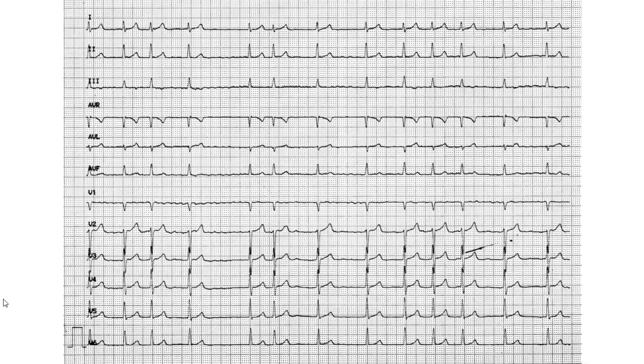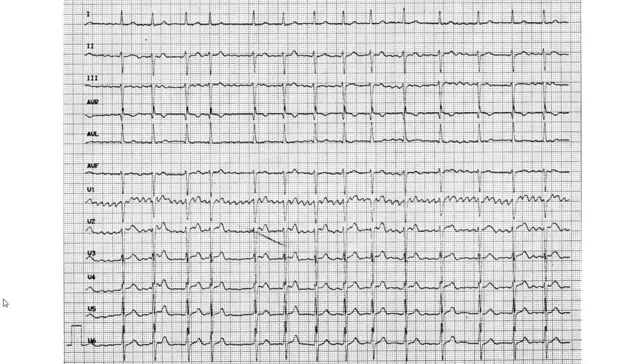So we left off. Which one did we finish? Now again, you can pause if you like. 3, 2, 1. So here again, we're going to do the whole regularity thing. You can pause if you like and try it out, and then come back. This is question 19. Okay, if you'd like to try it out first. Okay, so let's start off.